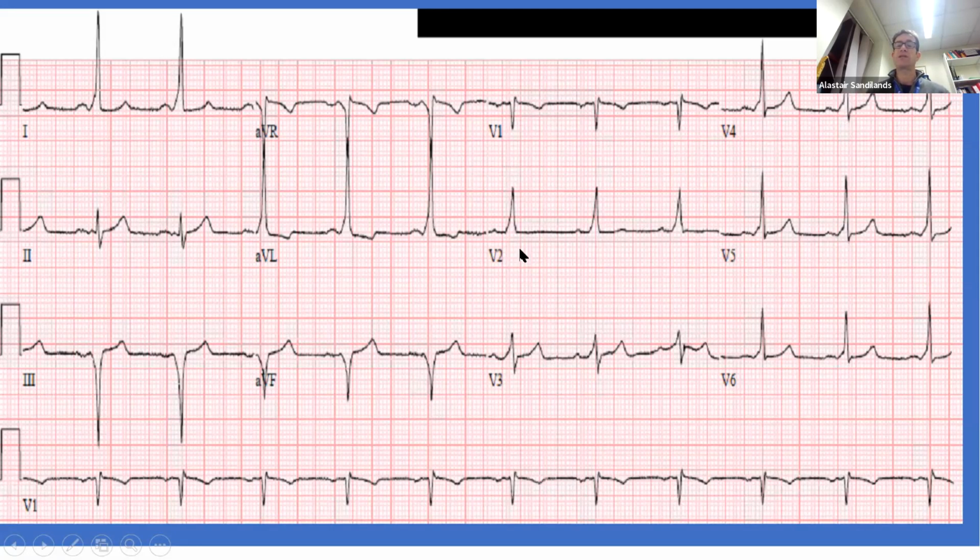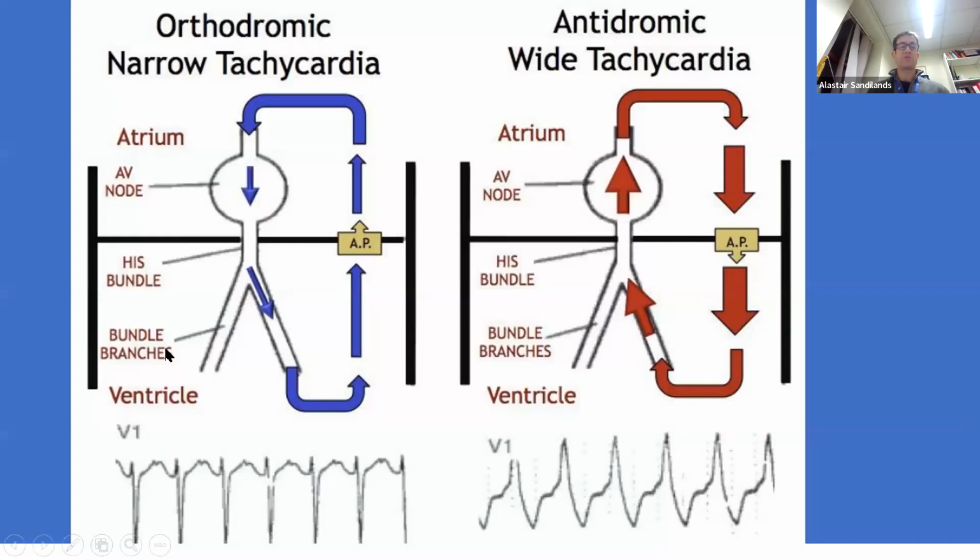That's a syndrome, but this is the delta wave. So in the resting state, they have a pathway that's conducting from the sinus node to the ventricles via the pathway. We've talked about when this patient would get narrow complex tachycardia when it goes down the node, back up the ventricle, up to the accessory pathway, re-entering the atrium.